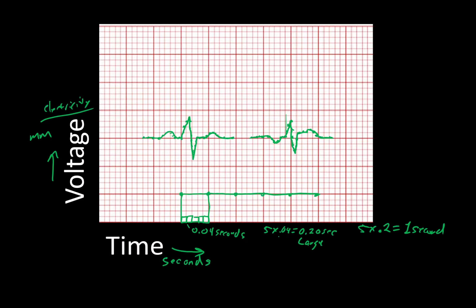Those are the ideas behind it. It's just an instantaneous measurement of all the electricity and whichever direction it's flowing. So let's find out some names for all of these waves.